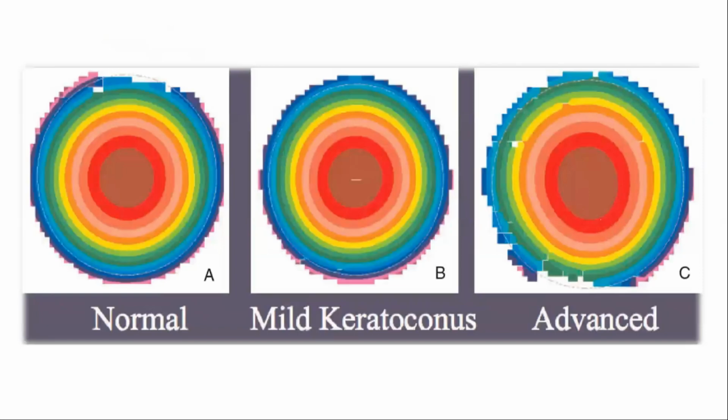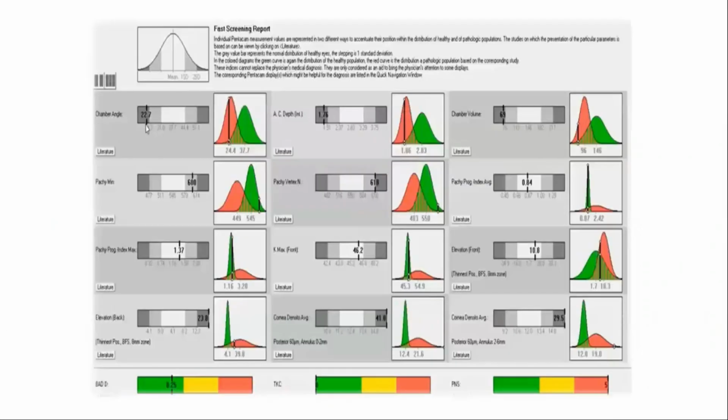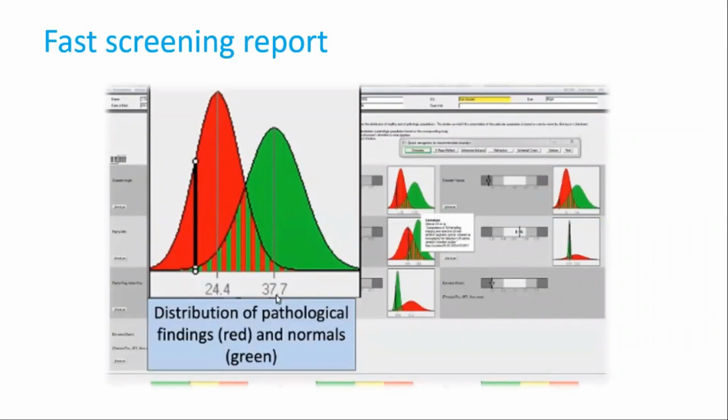Here, Tulasi, can I interrupt you for a moment? I was just thinking if we can go back to the previous one, and you can tell us about this particular one which you were showing, and then on each of them, for this particular patient, was it normal or abnormal, and what was the significance? A small discussion on that if we can have. For example, here the black bar is in the red over here. So what does that signify?